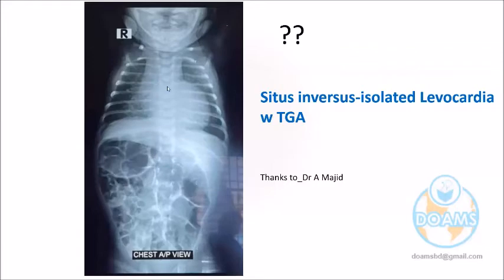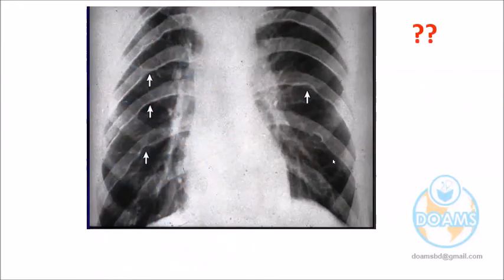Okay, aorta and the pulmonary trunk, there is transposition. Transposition means left to the right, right to the left connected. Okay, so our colleague actually posted in the media and I have collected it. Now here, what you are looking at, an arrow is given to you.